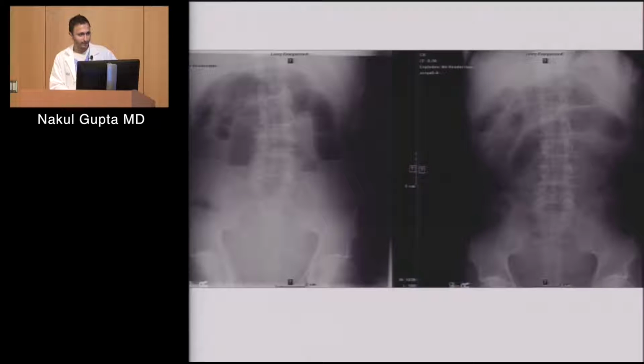All right, I'll let you guys take a look at these two frontal views of the abdomen. I believe this is upright, this is supine, same patient. All right, so what we see here, we'll start with the supine view. We see these tubular air-filled structures, right? These are bowel loops. This is small bowel, I'm just saying based on the central location. And to me, this pattern of the folds here is more that of small bowel. So these are dilated small bowel loops.